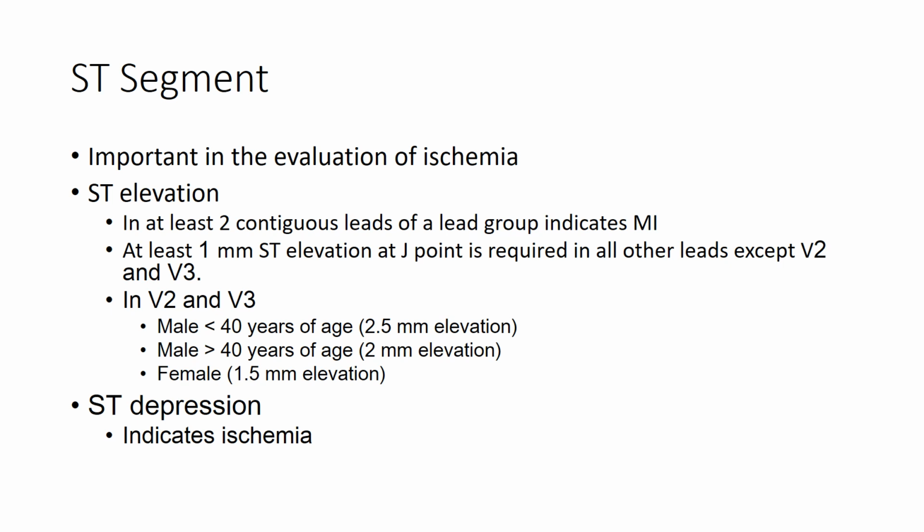And the criteria for V2 and V3 vary according to age as well as gender. In males less than 40 years of age, the ST segment elevation required in V2 and V3 is at least 2.5 mm, and in males more than 40 years of age, 2 mm of ST segment elevation in these two leads is sufficient to diagnose acute myocardial infarction. In females this criterion is 1.5 mm elevation at the J point in leads V2 and V3 for the diagnosis of acute ST segment elevation myocardial infarction. And ST segment depression, when present, usually indicates ischemia.